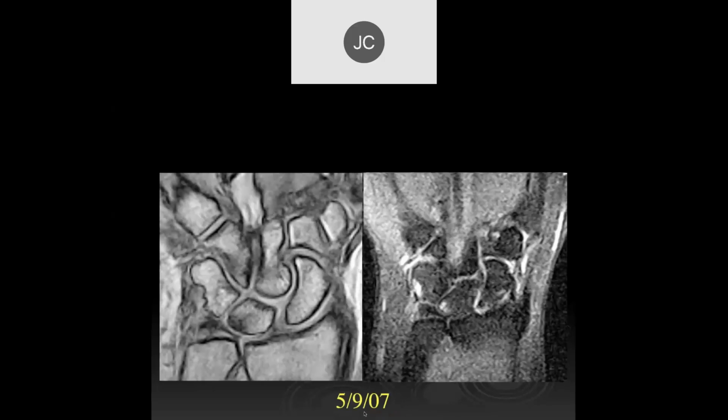All right, looks like we have erosion of that ulnar styloid and the lunotriquetrum. It's a lot of synovial thickening there. Right. Okay. And also in this state, 7/21/04. And then now you came back almost 3 years later, and this is what it looked like. Well, there are definitely more mature erosions, but they were definitely smaller in area than the original.